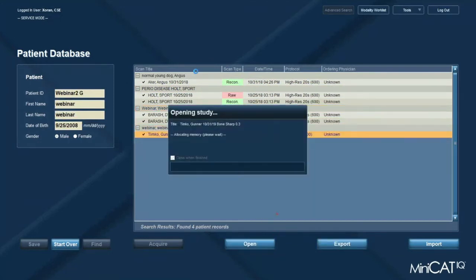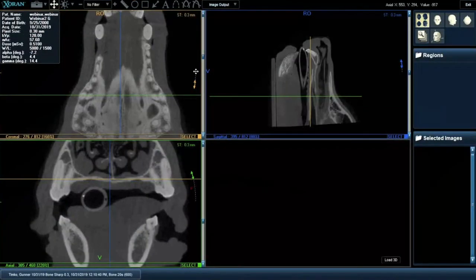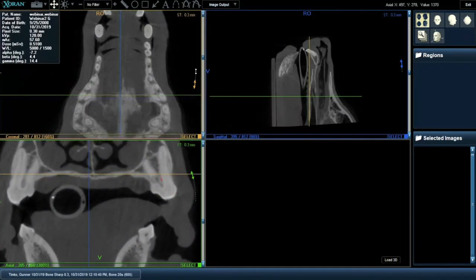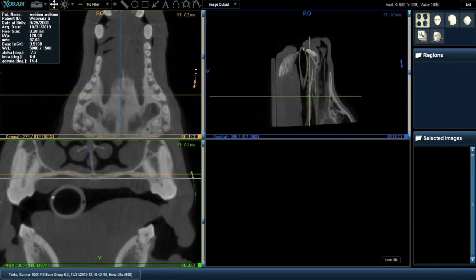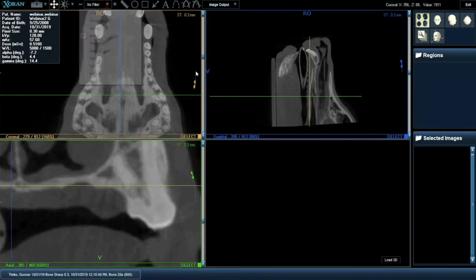Here's another patient, also normal anatomy, in a bit of an older patient this time. And here, again, this would be the way you would expect it to be right at the moment you scan the patient, literally about 40-50 seconds after the scan is completed. This time again, we see bone level that varies a little bit from area to area. We see this bone level here, for instance, if I was to zoom in on that spot. And we make this image a little sharper so we can see it better.